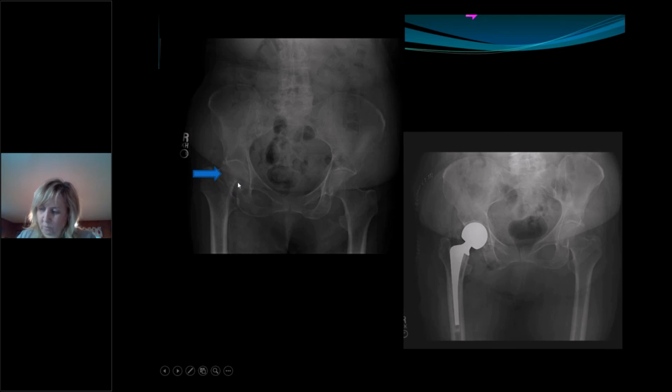And this patient has a femoral neck fracture. Unfortunately, it's displaced enough that it needs what they call a bipolar prosthesis. So this fracture gets this solution, and that incision extends from here all the way down. So it's a big open surgery. And so you can see how that could really increase mortality in the older population.